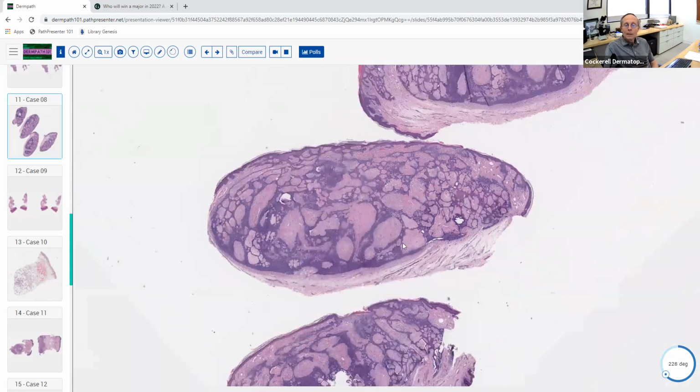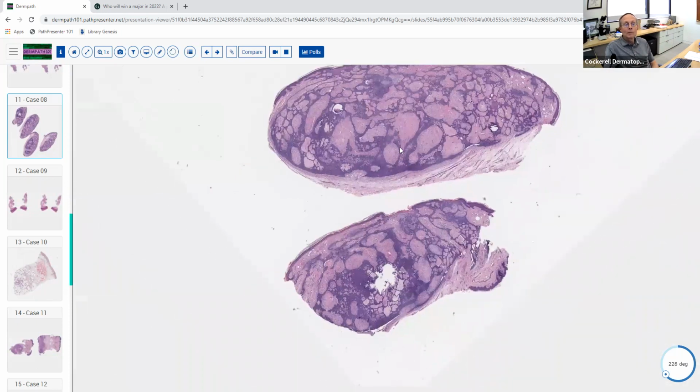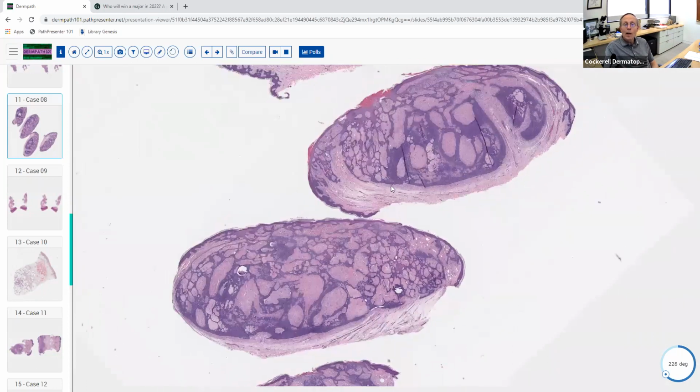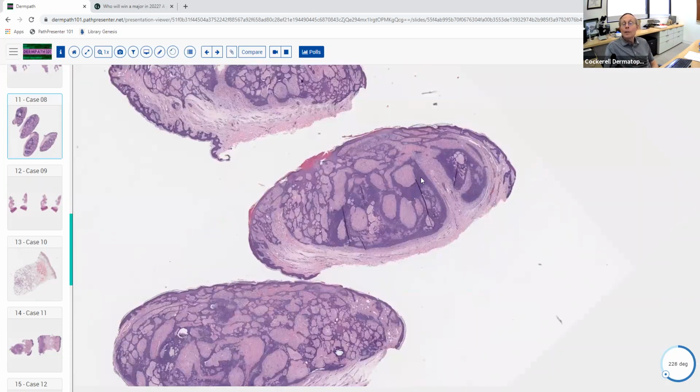Okay, great. So anyway, you can think of it as a basal cell, but it's probably not truly a basal cell. But when you get that basaloid morphology, think of follicles, you can think of sebaceous glands, you think of things that kind of live in that mantle zone area. The germinative cells of a sebaceous lesion can do that.